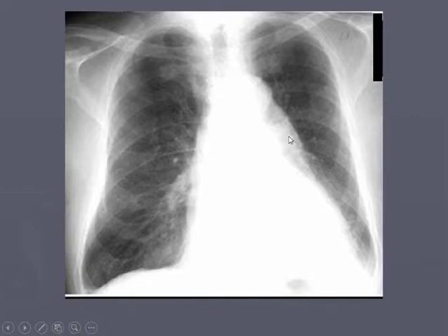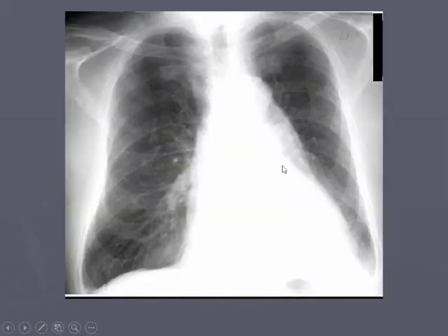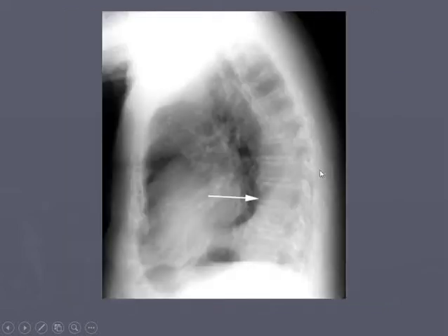On this example, you're looking at it and you can see this big triangle business here. What are we missing? Well, this is the aortic knob, but you can see this big density right over here that's not being inflated out. On the lateral view, you say, well, geez, is this like a middle lobe, like a lingular thing, or is it a lower lobe issue? On the lateral view, you can see this area over here, again, upper, middle, and then lowest over here. You can see the lower lobe is full of a gray area, suggestive of a lower lobe atelectasis.